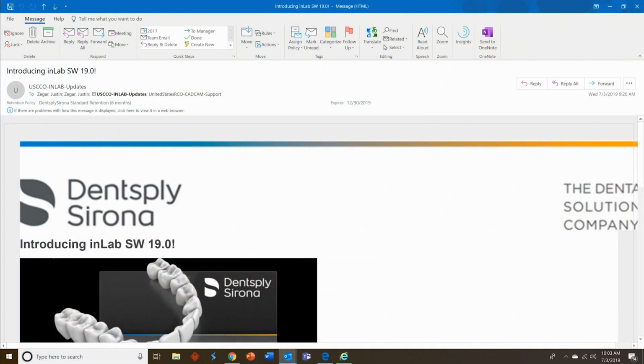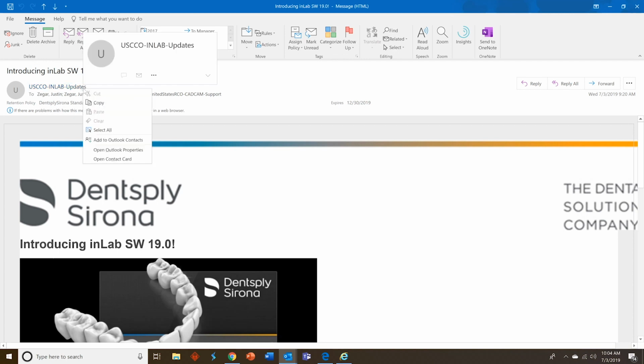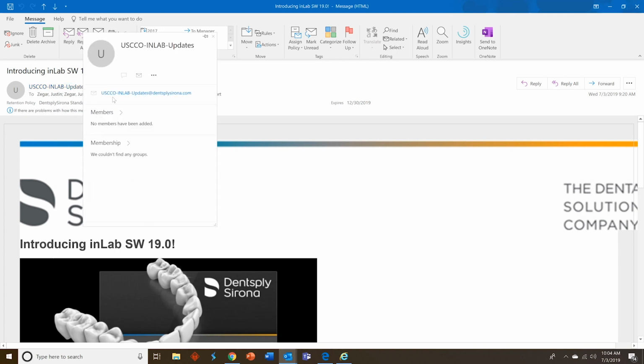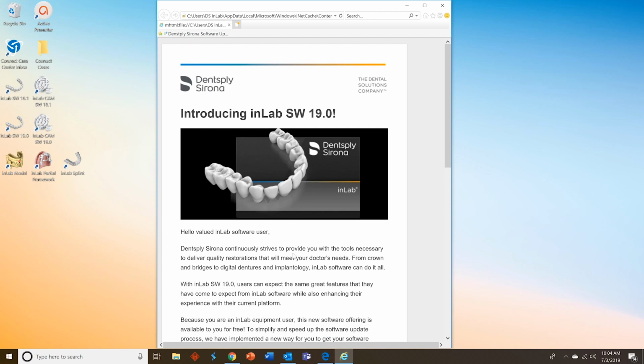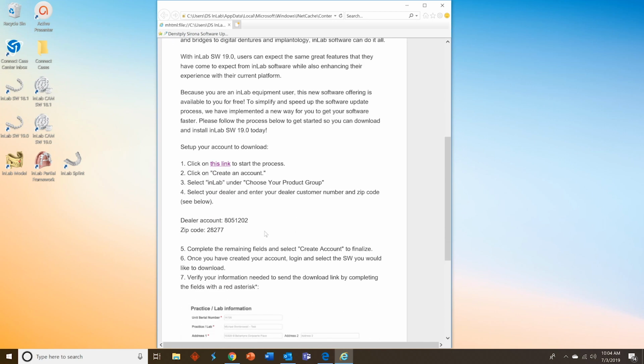Welcome to this video tutorial on our brand new launch process for inLab Software 19. In this video, we will review what you need to do in order to get your copy of inLab Software 19. Let's get started. The first thing you want to do is look for an email that says Introducing inLab Software 19.0. This email will come from an email address that says USCCO inLab updates at dentsplySirona.com. If you don't see this email, make sure you check your spam or junk mail. Once you find the email, make sure that you scroll down and follow the steps in order to start the process.